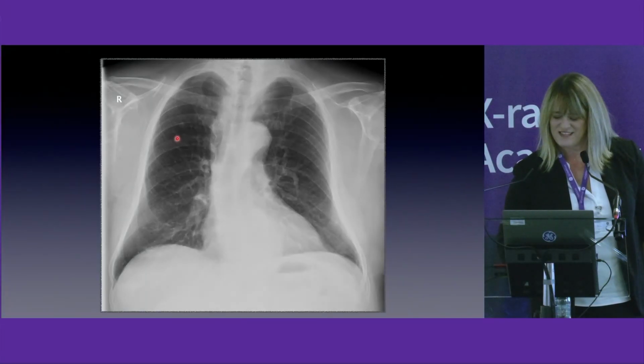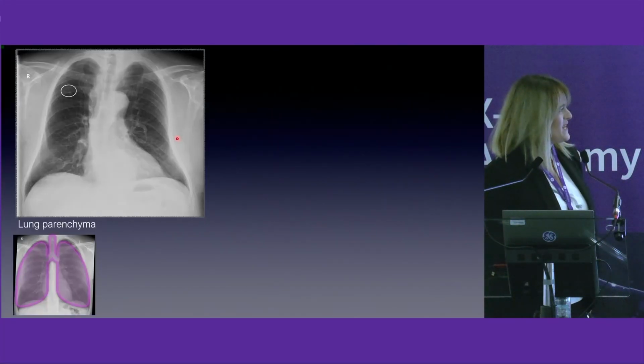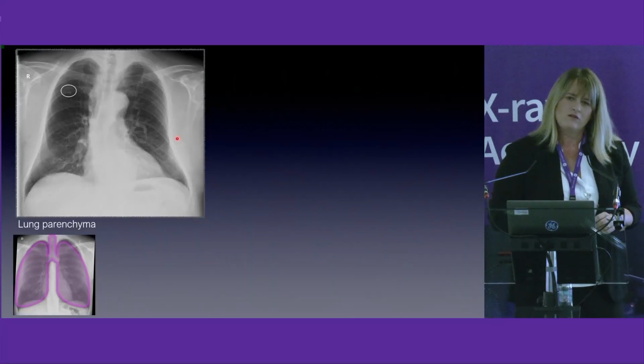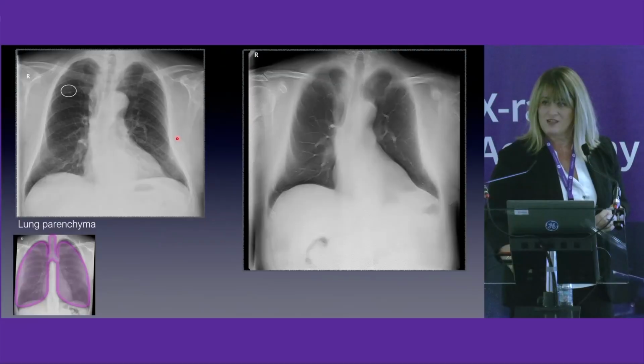That's very interesting. That's the same we noticed on this chest X-ray. So, in this old patient, are you sure that this is a nodule or just a bone island? We don't know. So we performed digital tomosynthesis.